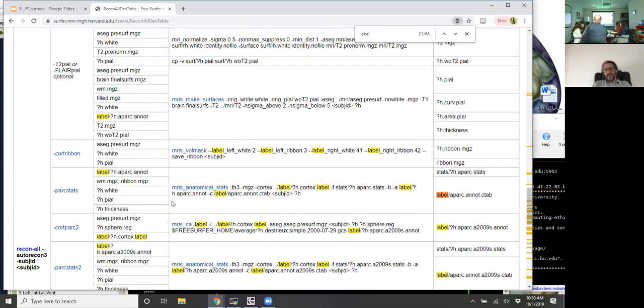Right, because the annotation is just a list that for every vertex gives you a number that identifies which ROI that particular vertex belongs to, but it's listed for as many vertices as the raw first tessellation, not the fsaverage resampling of the tessellation. So I was wondering if there is a second version of the annotation files already containing the number of vertices which match the fsaverage space rather than the raw tessellation of each subject. I don't know if that's the case.